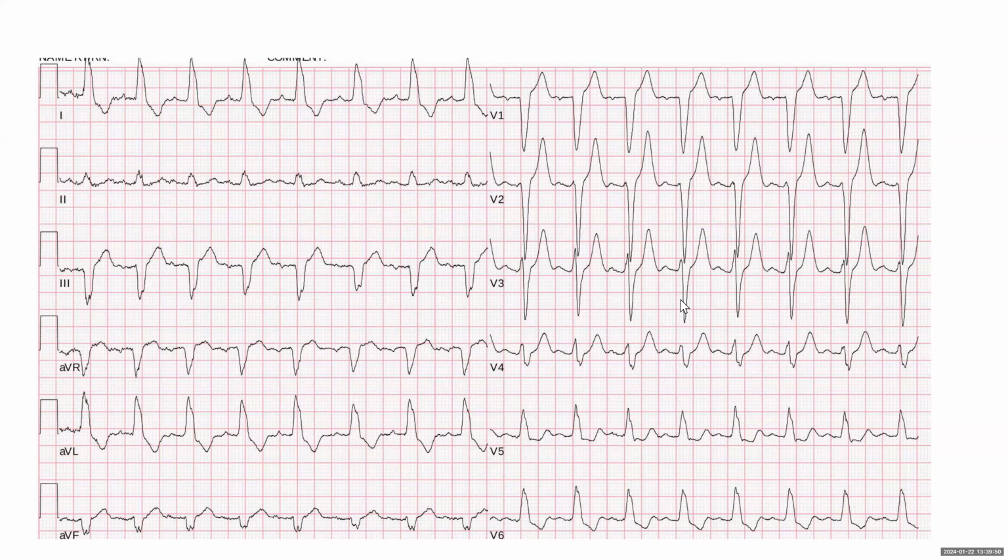Okay, good. So sinus tachycardia, I think this is obvious. Left bundle branch block, first degree AV block, STT changes. These are the obvious ones. Then you could code artifact. I think that would be fair. You see it in lead 2, for example.